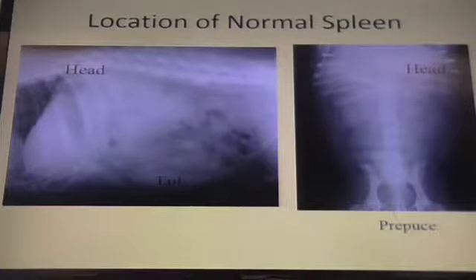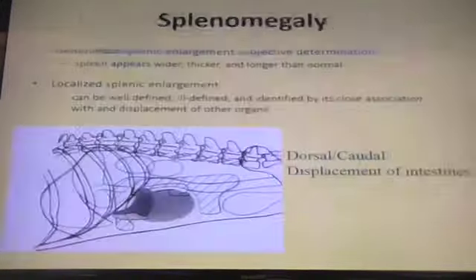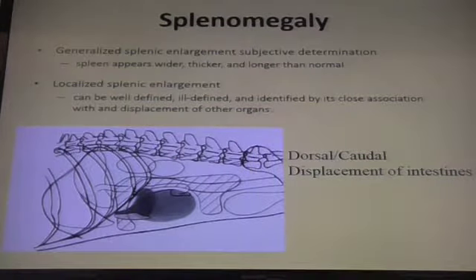If the structure was intra-abdominal, you would not see it because it blends in with the rest of the soft tissue. Everybody understand that? So is the prepuce commonly mistaken for the bladder? Yes. But you notice the bladder should not be that opaque if it's intra-abdominal unless it's calcified. Now you can say calcification in the bladder, I'll take that. But just remember the prepuce, any extra-abdominal structures, same thing with the thorax, cause opacity.